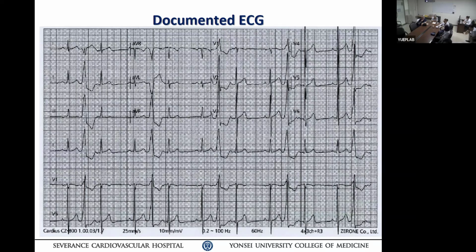You're not just reading the rhythm. If you want to know about the patient, what does the P wave look like? Now, P wave axis is what? Normal or abnormal? Lead 1 is the most constant, right? Is that normal? Normal. What is the P wave's most dominant axis? Lead 2. Lead 1 is bigger than 2. So that means a slight leftward axis deviation of the P wave.